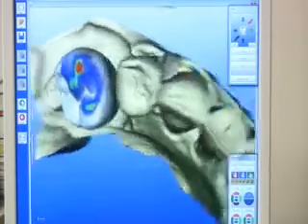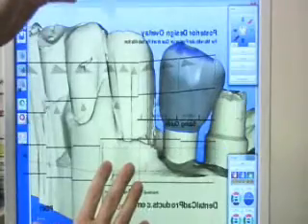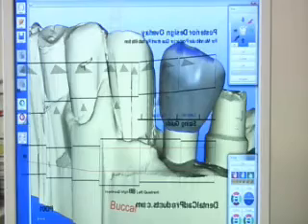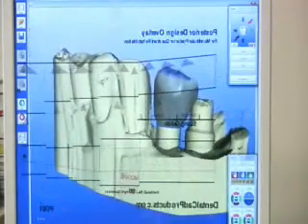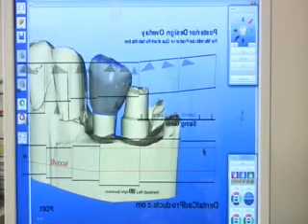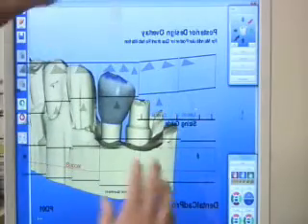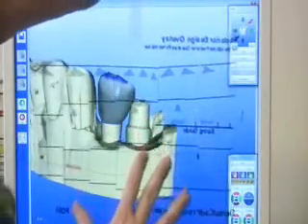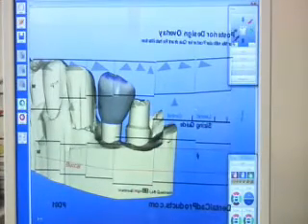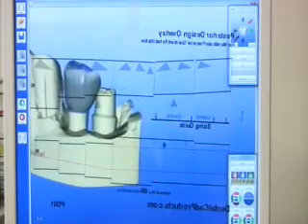We render our proposal. You can see our mesial marginal ridge is open. To try to get the mesial distal width of the premolar, we're going to be resizing the virtual model by using the zoom function. And we know that the second premolar is approximately the same width as the mandibular first premolar. We resize the virtual model, place the posterior overlay, and will give us our references for the mesial and distal width.